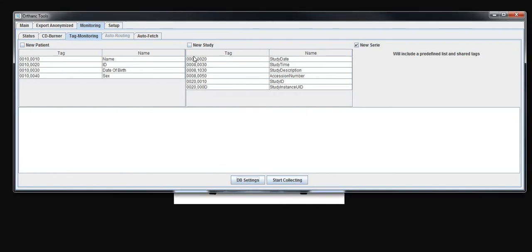And then it will put the values, for example, of injected dose, etc. There is a predefined list of monitored values that will be stored in your database, and then you will be able to make statistics on these values. So you will automatically extract data coming from your center to monitor some key factors coming from DICOM information.